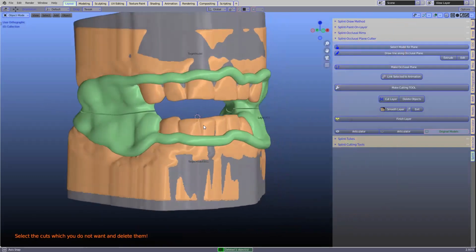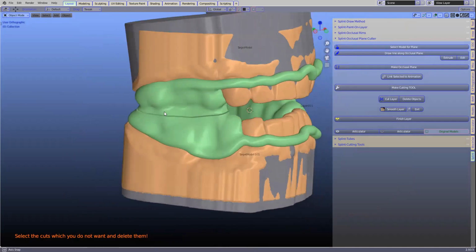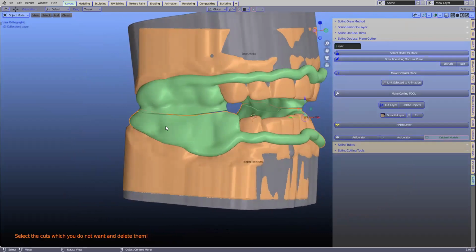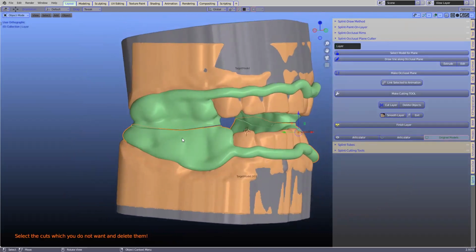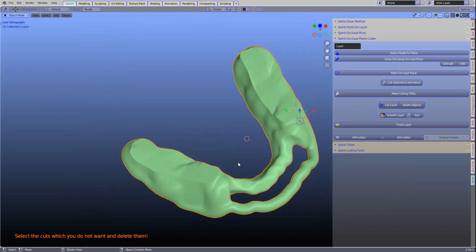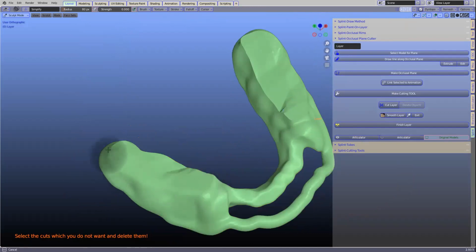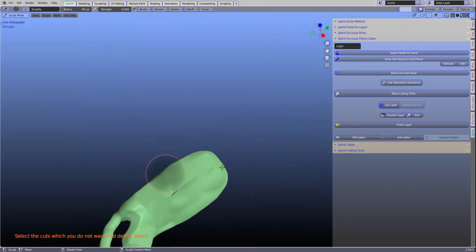This cut is 0.3. It looks big. In reality, 0.3 is like your fingernail or something. You know, it's actually very thin. I'm going to take this and I'm going to briefly smooth this out. Okay, so to hide the inverse, select Control I and hide. I use it all the time. Control I and H. Smooth it. And here we're just briefly going to go across and smooth this.